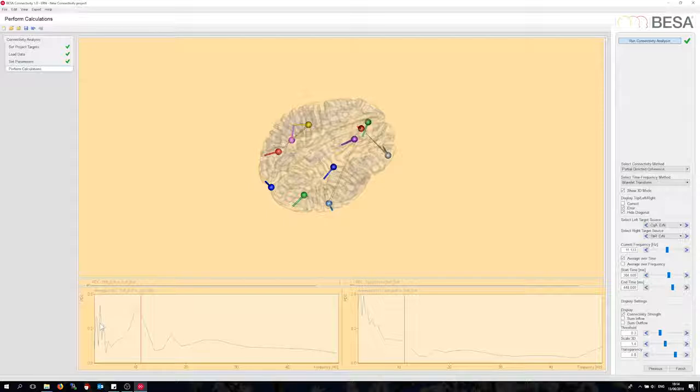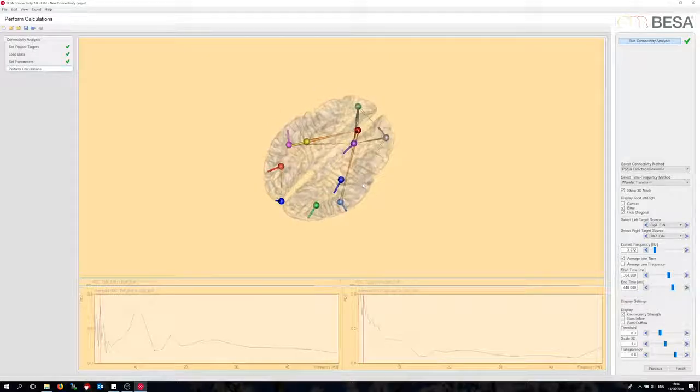Now I can see the peaks at the left side of the detail windows. And I go down to the largest peak at around 3 Hz and directly see the network. It emerges that the network for the correct response is more complex than in any case of erroneous responses.